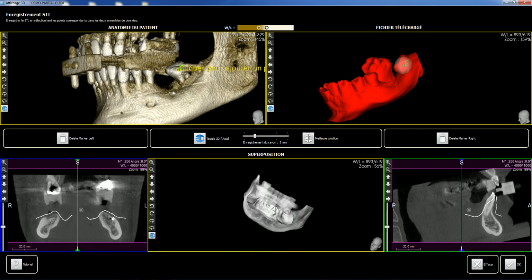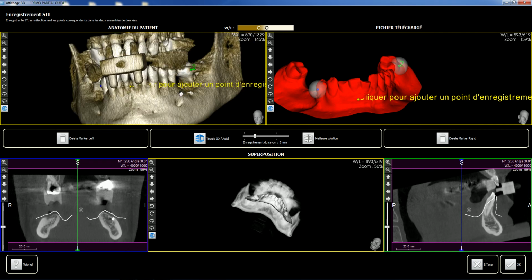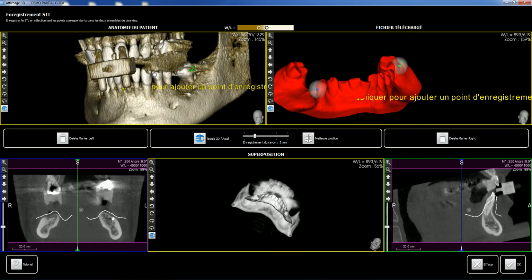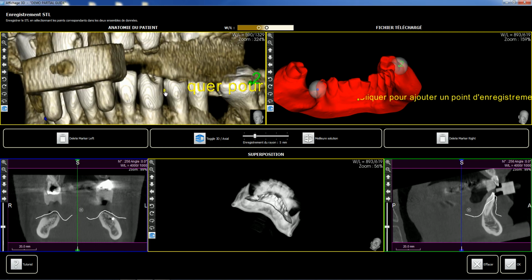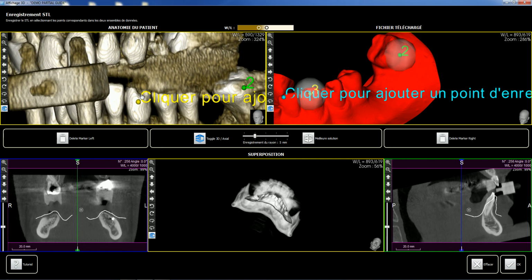And just to make sure, I'm going to use a third point, maybe even a fourth point. So just turn around. Now I'm going to use one tooth that is quite relevant. Which tooth is the perfect one? Yeah, this one is very easy to identify because this tooth has a crack on the occlusal surface. So there we go. I will just orientate a little bit more here as well, zoom in. Okay, just in the bump I'm going to make one reference point in addition, and right here the same thing in the little bump.